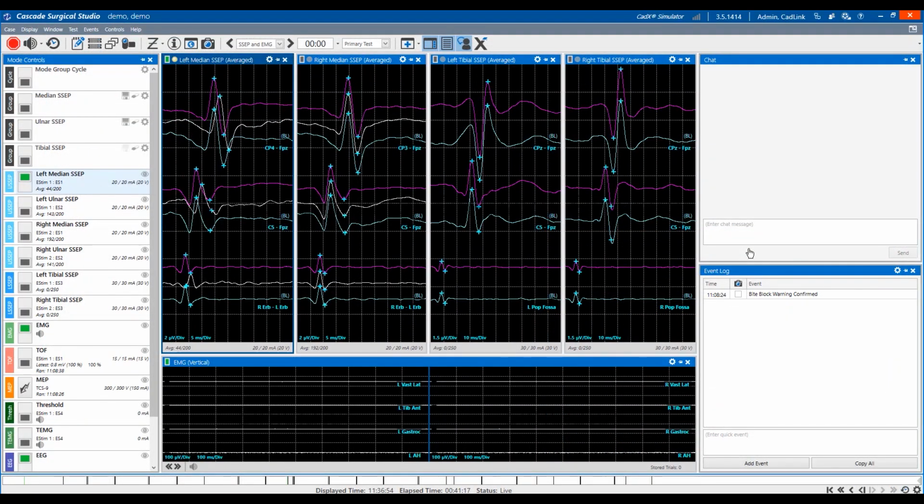When a latency or amplitude shift is observed, users can adjust the cursor to the new latency, and the cursor midpoint is automatically adjusted. In previous versions, users had to right-click and adjust cursor midpoint, but this is no longer necessary. Also, cursor alerts now apply only to latency increases and amplitude decreases.